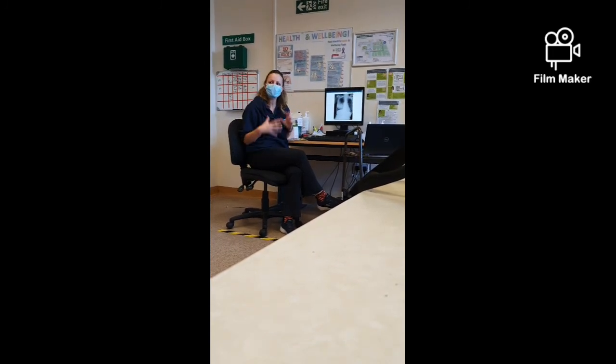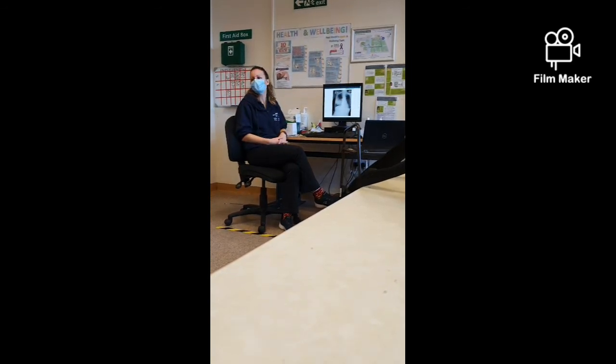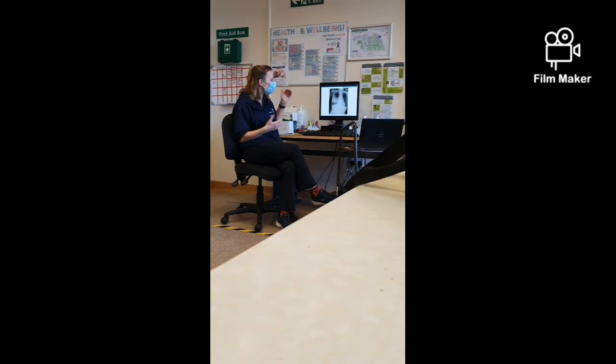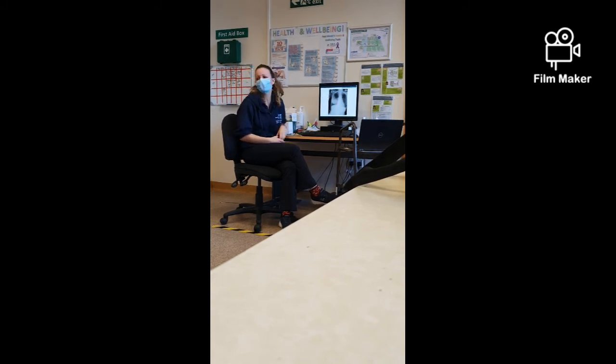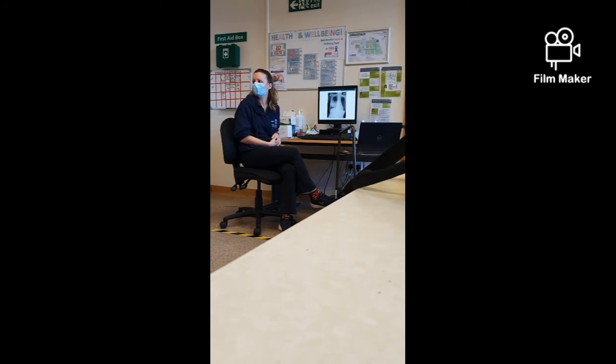Okay. Questions? Everyone happy with that? I think the question is, when you look at that chest X-ray, can you tell it's not right? Yeah. Excellent. So once we can tell it's not right, it's then just going through that process and seeing, well, what is wrong? And even if you can't diagnose that as consolidation, you know that something's going on in the right lung. And then what can we also do, in our respiratory assessment, to sort of clarify that?